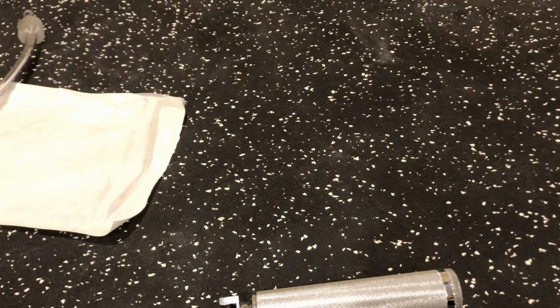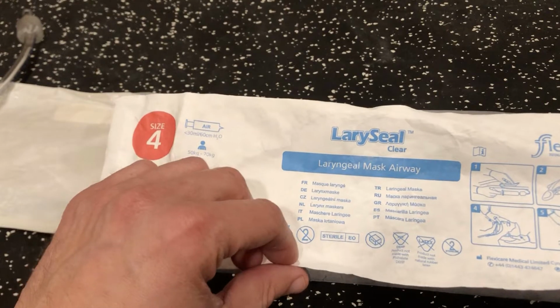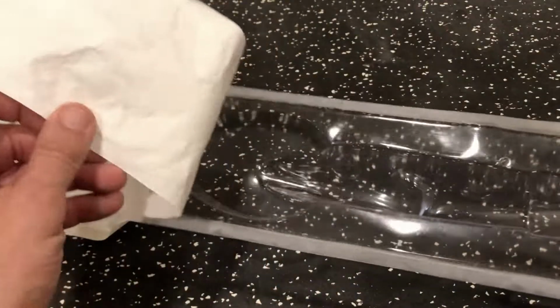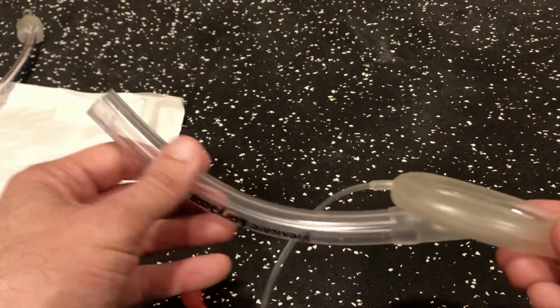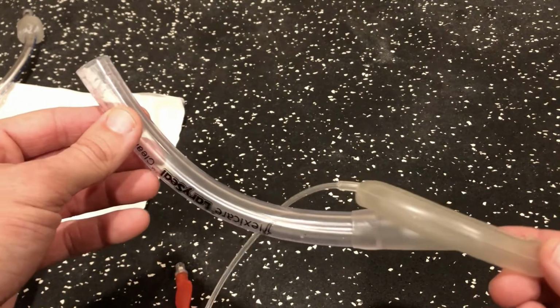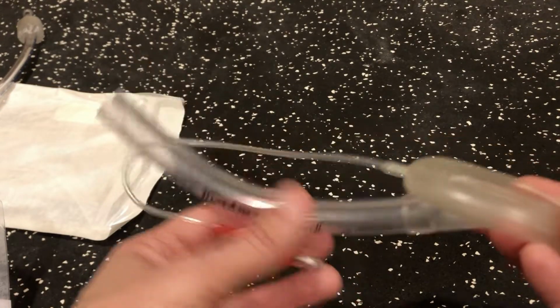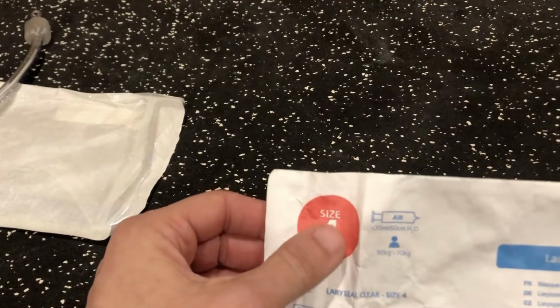Another airway tool that doctors may ask for, and we have in our emergency kit, is what's called a laryngeal mask airway, or the laryngeal seal. This is similar to an endotracheal tube, and the way it works, it actually fits above the opening of the trachea and forms a seal. Again, you would need a syringe to attach to this to inflate this particular portion of the cuff. And you'll notice that these do come in many different sizes. The one that we had here was a size 4, but there's many different sizes. The size 4 is probably the most common.